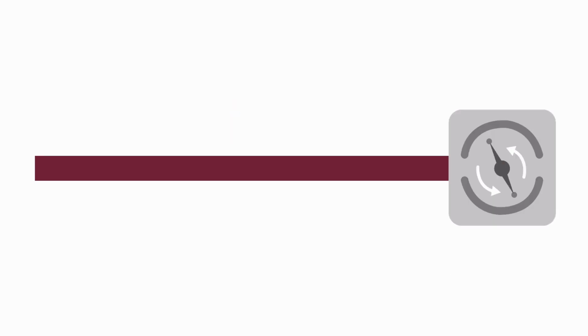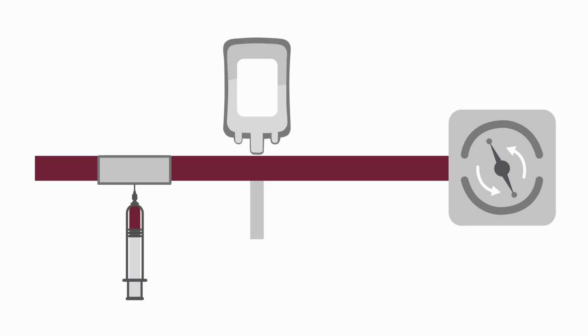Let's start by looking at the inflow bloodline pre-pump. Along this segment, there is a port through which you can collect blood samples, a saline line used to prime the dialyzer circuit and for rinse back at the end of dialysis, and an arterial pressure monitor which reads the negative pressure along this portion of this circuit. If the connection is broken along this portion, air can enter the bloodline.